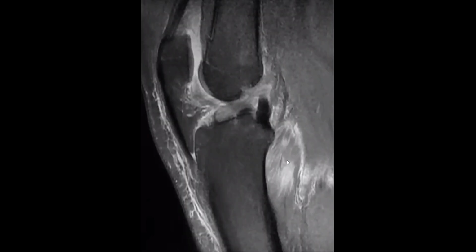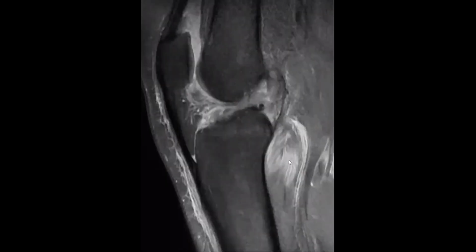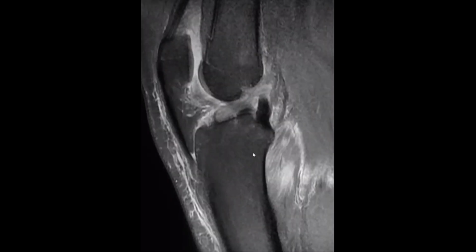I am sorry to disturb you, but you are picking up the findings very quickly and perfectly, and I would just like to stop here. What are the abnormalities? You said the anterior cruciate ligament. Let us focus on the ligament first. The anterior cruciate ligament, is it good or not good? No, sir, it's not good. I cannot see its fibers, its configuration. It's torn, completely torn, because it should be parallel to the Blumensaat line. This is the Blumensaat line, while this is the anterior cruciate ligament, and we have here interruption of the fibers.